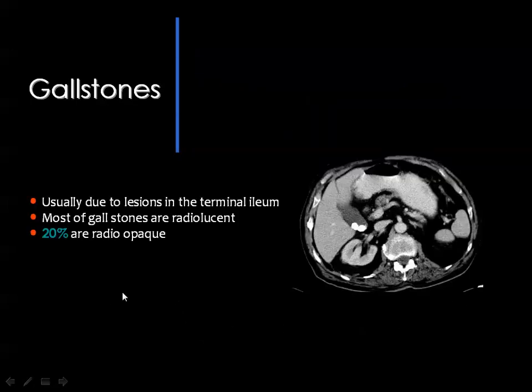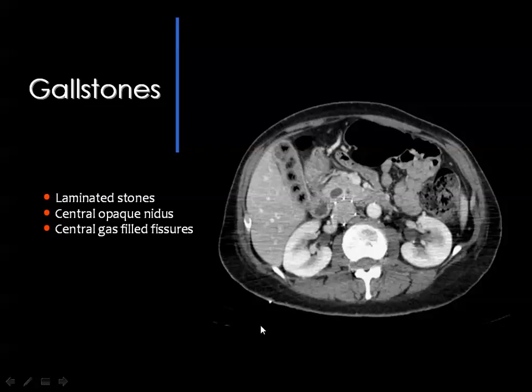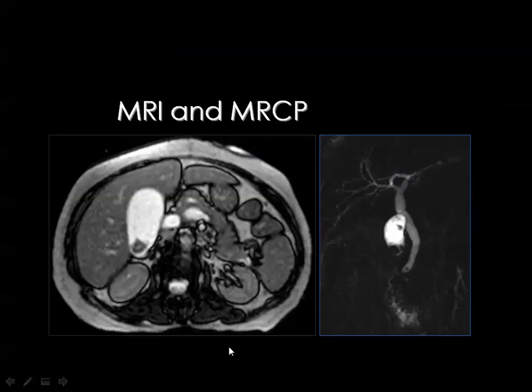Then this is the appearance of gallbladder calculi by CT. This is the gallbladder, and these are two radiopaque stones, and this is a frequent incidental finding during CT examinations performed for any other indications. And gallbladder stones also may contain gas sometimes, and you see this is multiple gallbladder calculi by CT scan, and you see extreme hypodensity within the stones representing gas.